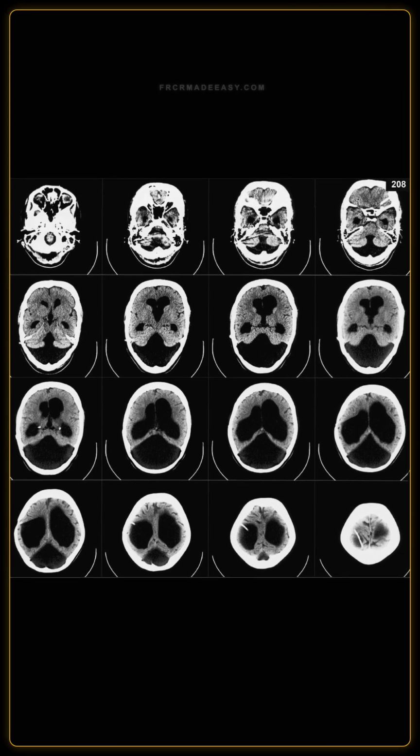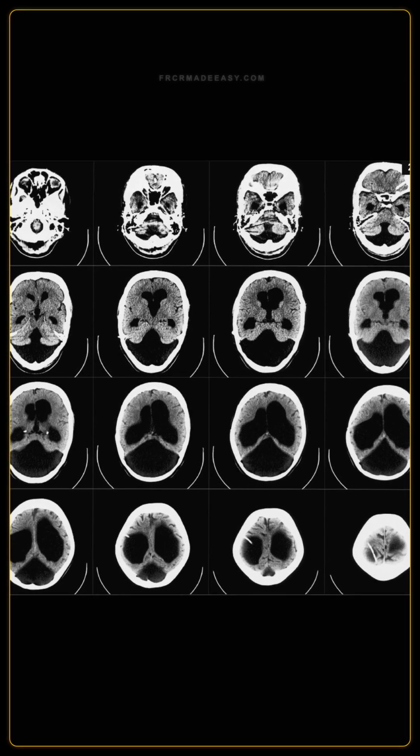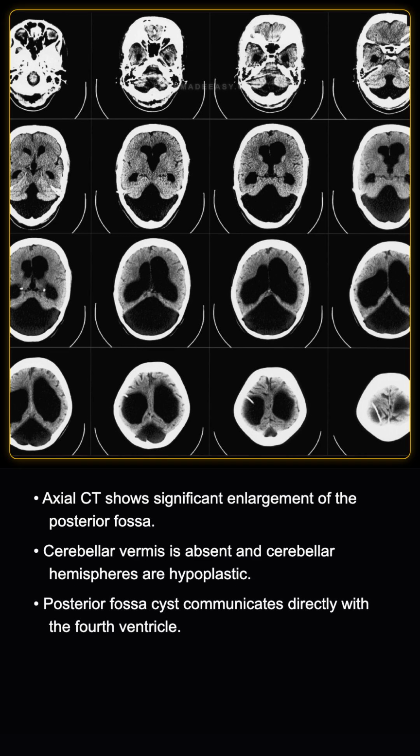An 11-month-old child with cleft palate, developmental delay, and progressive macrocephaly is referred for imaging. I am showing you an unenhanced axial CT of the head. Describe the findings.